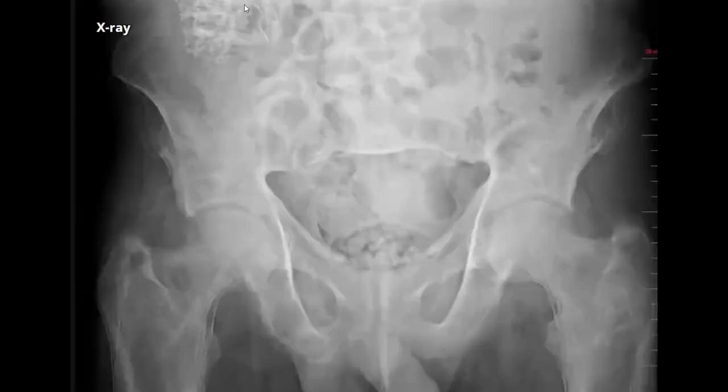Sometimes you can find the cause in such a metabolic super scan, as this patient has a transplant and has started to have even brown tumor features in the bones. So this goes well with a metabolic super scan.